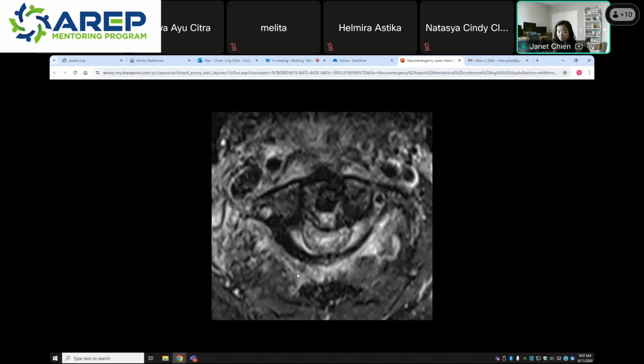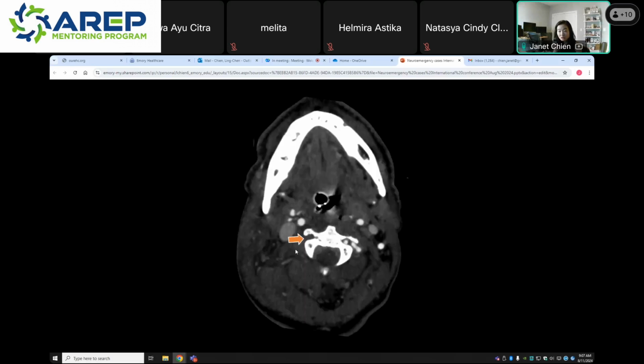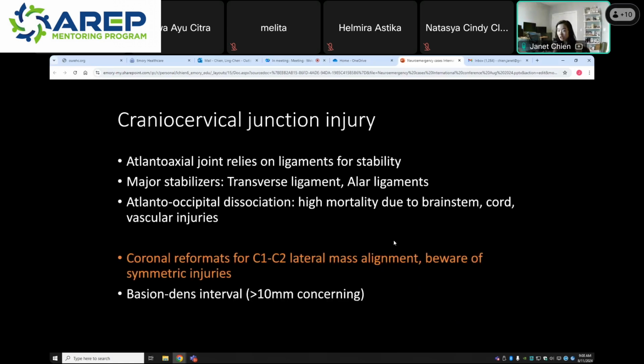And then very important to recognize here is also you've lost your right vertebral artery flow void. So your vertebral artery goes through the transverse foramen, right? This left vertebral artery is normal, has a normal dark flow void. You've lost it on the right. And so this is high-grade vascular injury with right vertebral artery occlusion. So this would be a grade 4 Denver or Biffl vascular injury. That's confirmed on CTA. That was a lot.